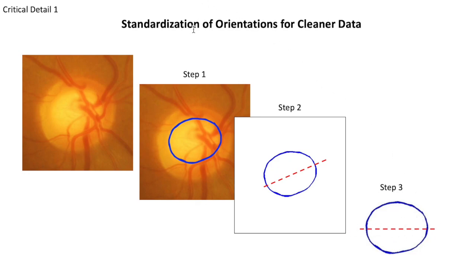By standardizing the orientations of all optic cups in this way, the data becomes much cleaner. We do this because nature inherently is polar. For example, North Pole versus South Pole, anterior versus posterior, and so forth. By standardizing the orientation like this, we discover that the data produced by ShapeGenie is much cleaner.